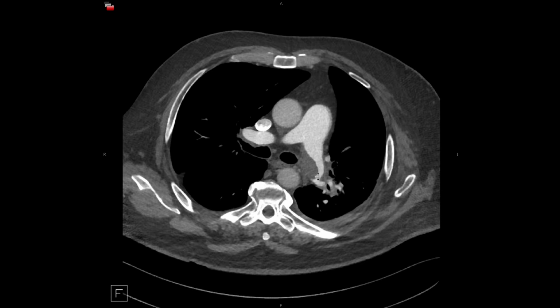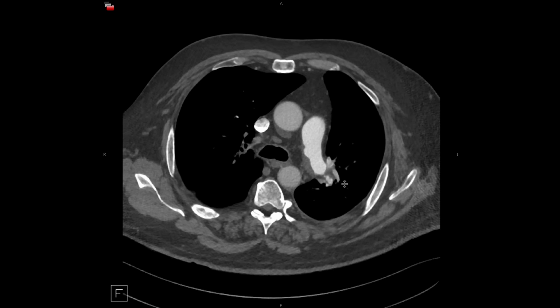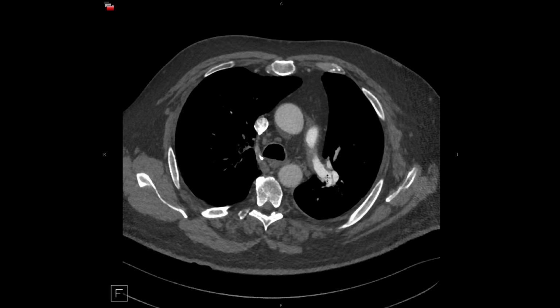So here we have mural-based thrombi with relatively concave margins in some areas at least. You can see here they appear to be adherent to the wall. The vessel is, of course, markedly narrowed. We have webs. There are some better examples in this case, but here's one small little web-like filling defect.